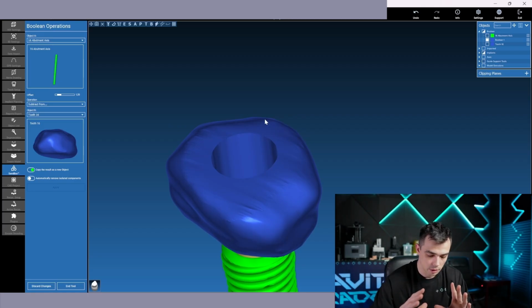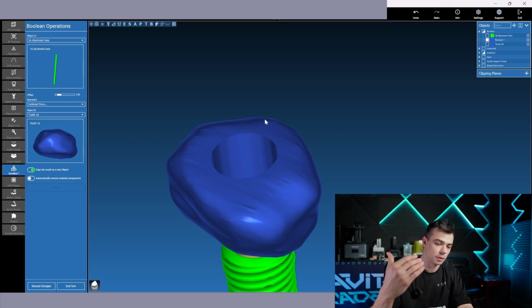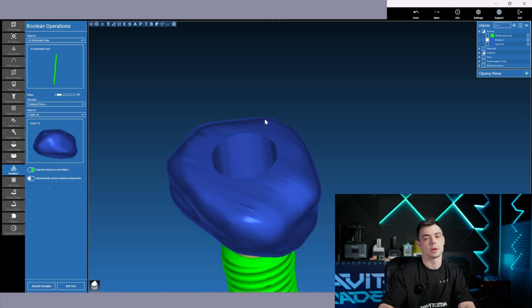Just a piece of advice for you, when you have finished your modeling and you can export this beautiful gum former. I mean, a piece of advice regarding the post-fabrication of it.